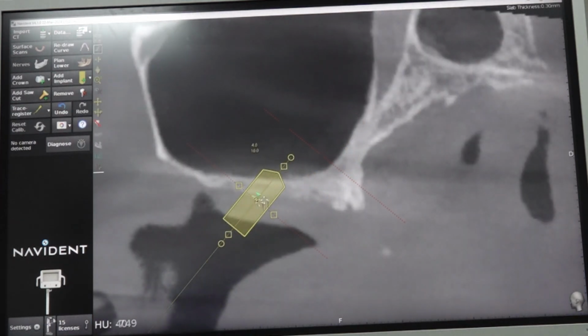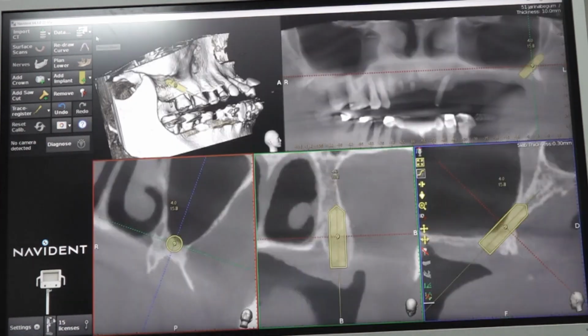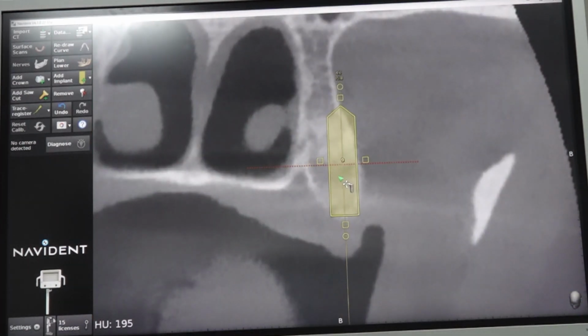See, the maxillary sinus has come to here. Okay. So if you start drilling and if you go like this, you will enter the sinus. Right? If you go like this, you will get less bone. So exactly you have to go in this direction. Right? Very thin bone will be a challenge. So the buccal cross section view. From buccal to palatally you are tilting it. If you go like this, you will come buccally. Perfect, the lateral pterygoid.